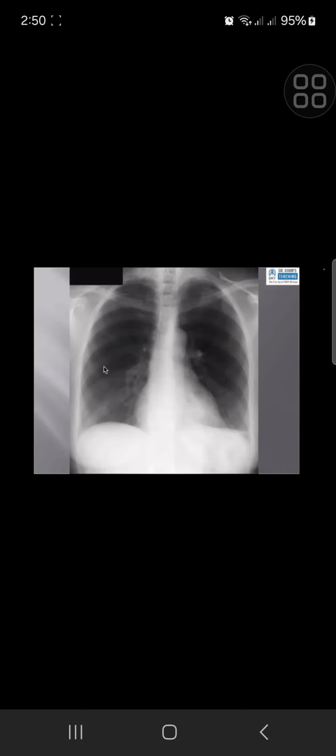Given that there is a solitary pulmonary mass in the left lower zone with possible left pleural effusion, and I cannot appreciate any destructive bone changes or hilar lymphadenopathy or any further lesions, I would be suspicious of a malignant etiology. I wonder whether this patient is a smoker. I would review their history, and I wonder about the patient's age as well, because if the history is not fitting with a malignancy, I would consider infection. So a CT would help me to differentiate.